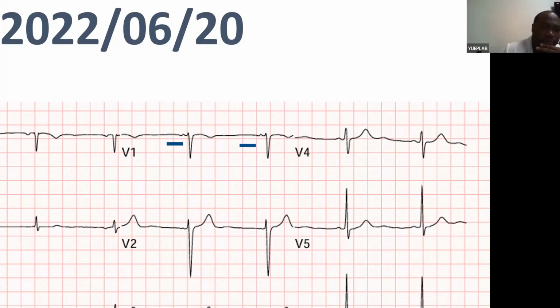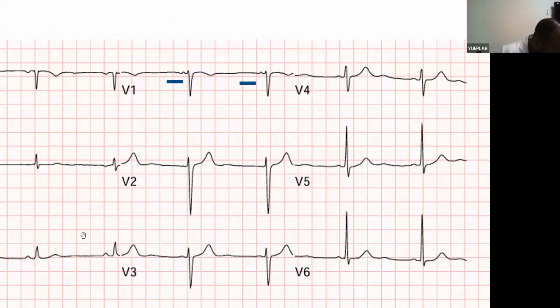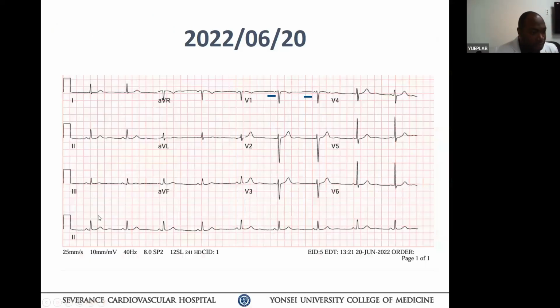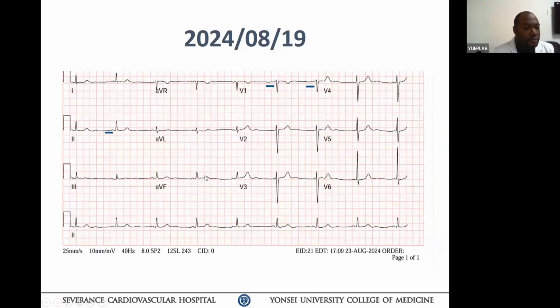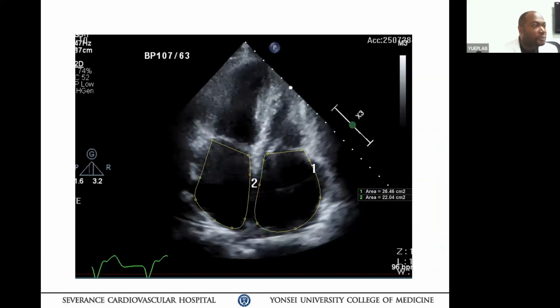That's a typical echo you see. Big biatrial enlargement, normal, small ventricle. Look at the echo. There's hyperechogenicity in the whole endocardium. Go take a look at the echo window. Okay, that's a typical pattern that we see. This one, 2024, is highly suspicious, but I cannot agree with it. Atrial myopathy, well, the question is what would be the answer; you just look at the echo.